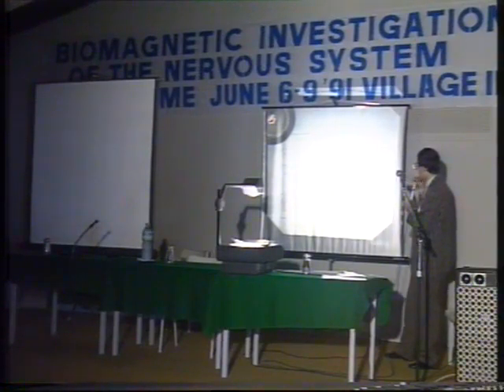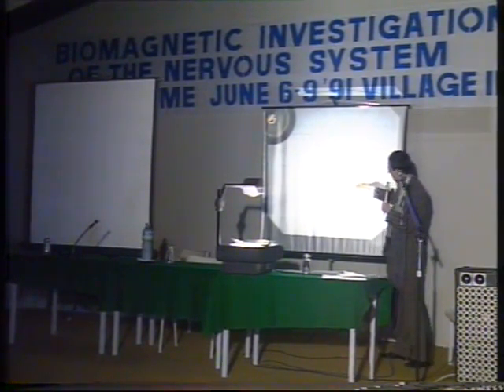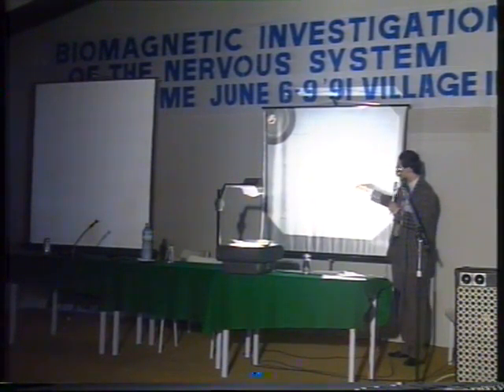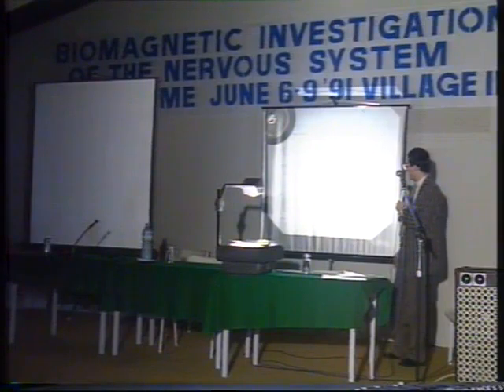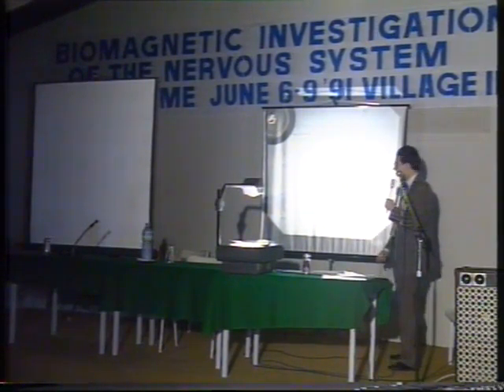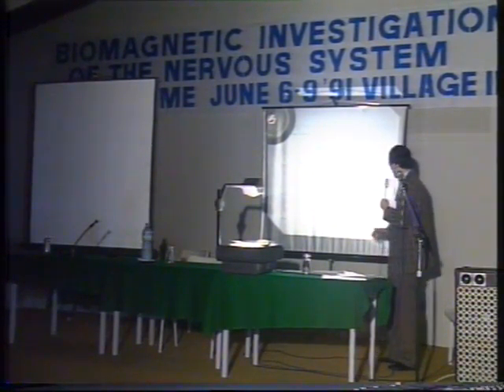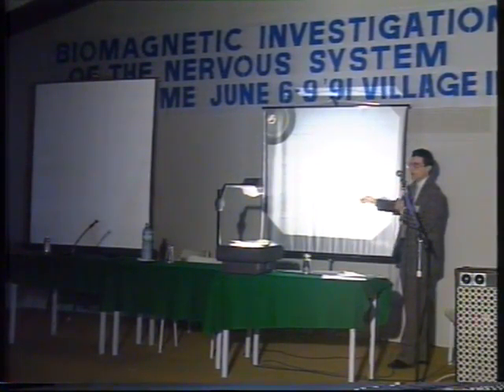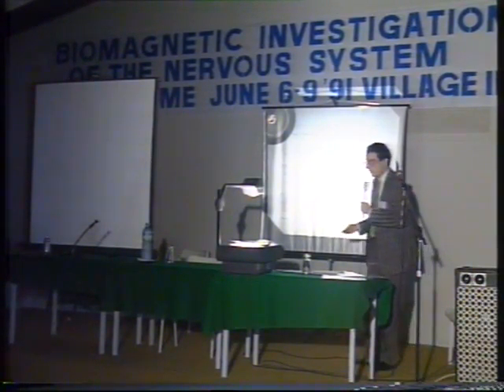And at 18, 19, this dipole starts coming out, and in this case we have the maximum amplitude at the 20 millisecond latency, exactly that one. And this is done on the right hemisphere, so left stimulation and right registration.